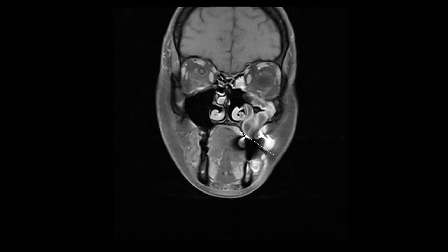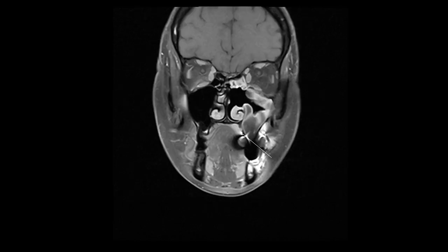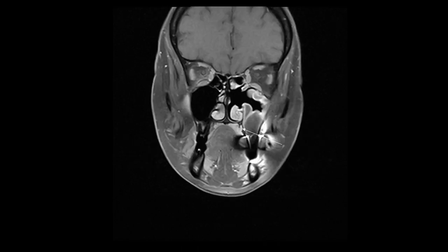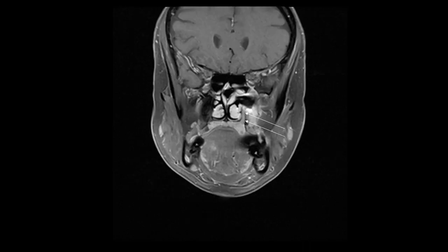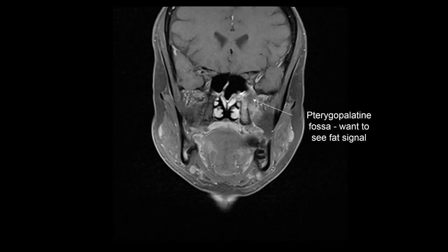So here's an example. This is a patient with an adenoid cystic carcinoma along the undersurface of the left hard palate, and let's follow the appearance of the nerves in this case. We can see that there is asymmetric enlargement and enhancement of the nerves as they rise up on the left side, following the tip of the arrows. Here we can see extension superiorly. So again, asymmetric enlargement and enhancement of the nerves are direct radiographic imaging features for perineural tumor spread.